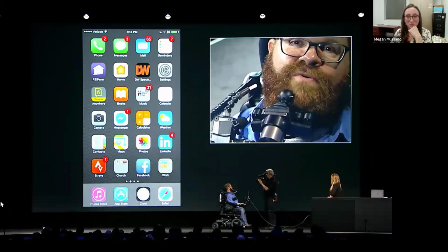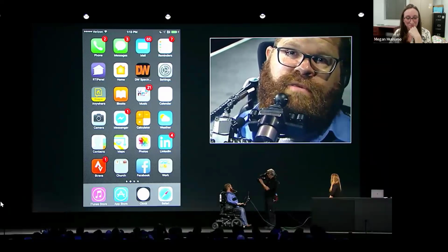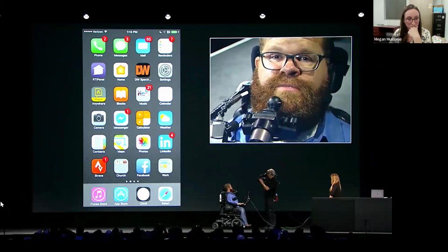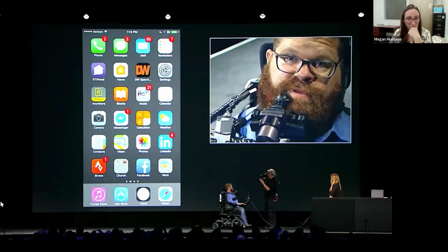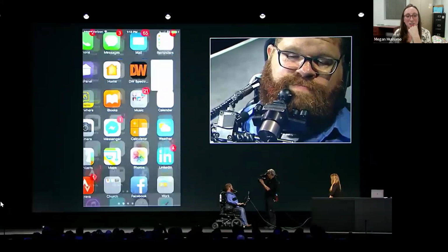There's a lot going on, folks, but I'm called old school. I'm called direct access. So what I'm going to do is explain some buttons and show you some things. Okay, so give me a second here. You can see he's scanning through.